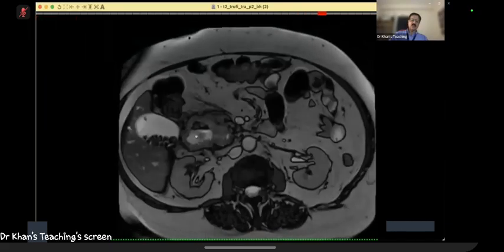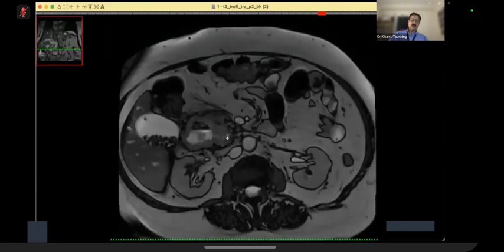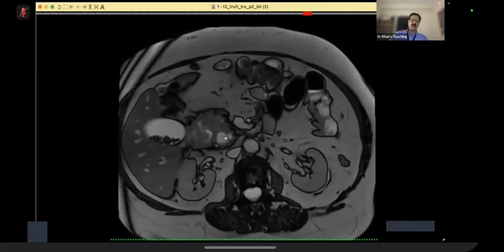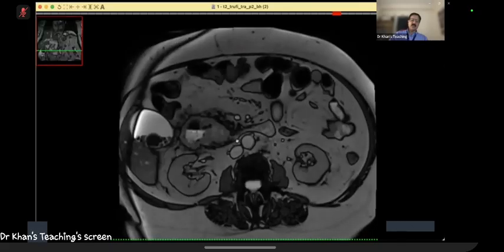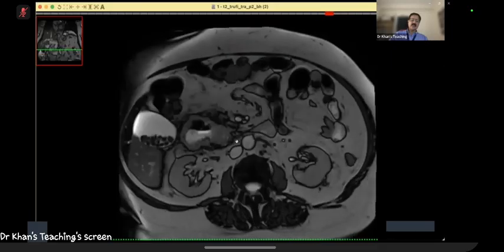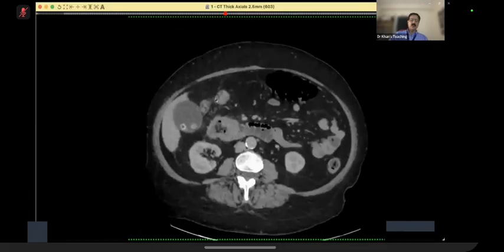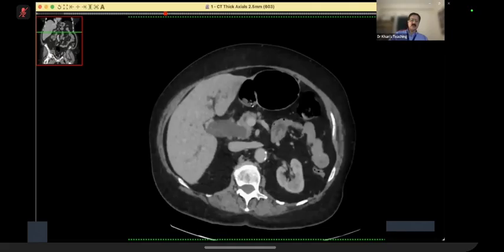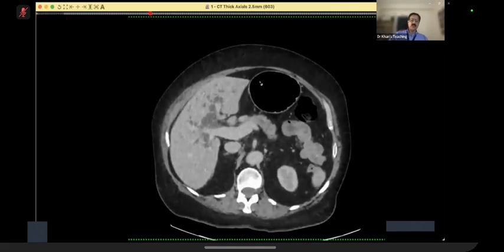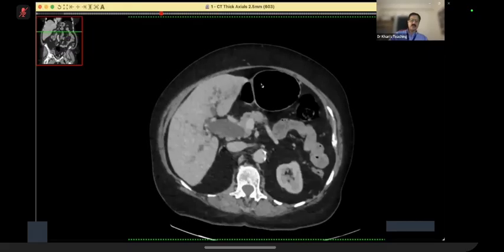So this is a stricture, a malignant stricture, and now you can actually see how it invades the CBD and obstructs. Till now, I think the pancreatic duct is just next to it. So that is why double duct sign is not all that emphatic, but very soon it will become. As far as everything which you need to see, you can see it on this phase. There is no need of multiple phases.